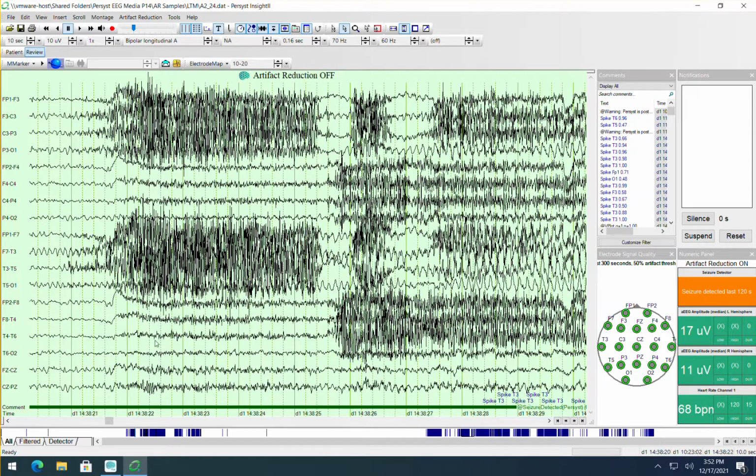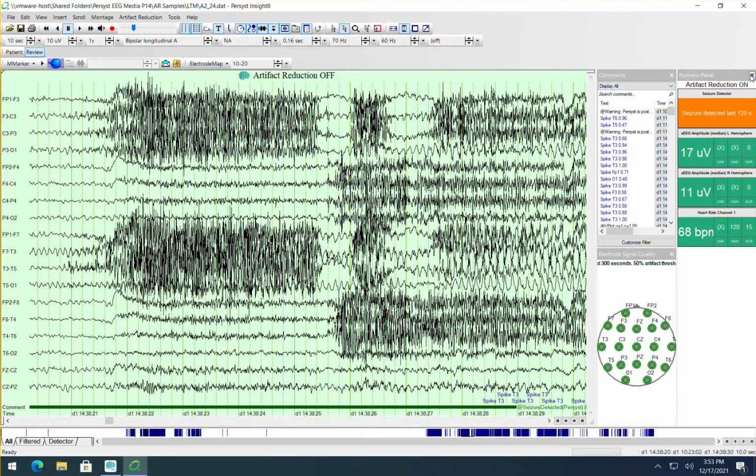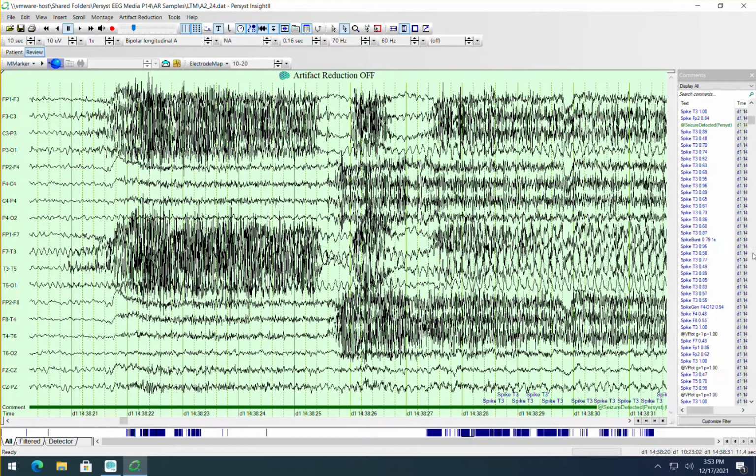Let's go ahead and get started now. When we launch Insight 2 from a fresh installation, it's going to look like this, with all the displays being shown, toolbars moved over to the left so that we make sure that we're displaying them all regardless of screen configuration. Let's go ahead and tidy this up. And once we do that, close the program. It remembers what we've done and how we position things. I'm going to close these displays. Just leave our comment window up there on the right. And all these toolbars are movable.